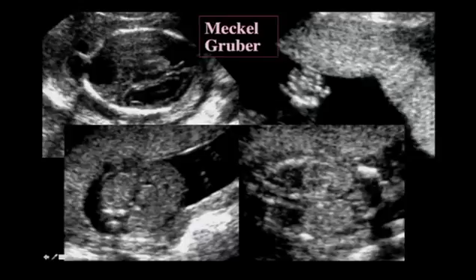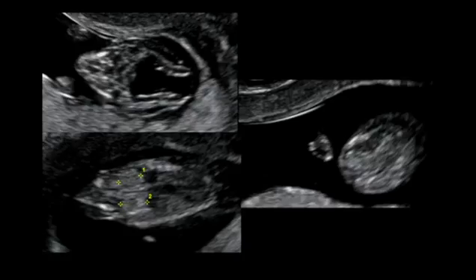Now, this can be diagnosed very early. This is one of the earliest times I've diagnosed it. You can see that the picture of the head transversely shows a large cyst in the back of the brain with a posterior encephalocele. And once you see that, you have to wonder about Meckel-Gruber syndrome. And so you would look for the sentinel feature. What is going to nail your diagnosis?